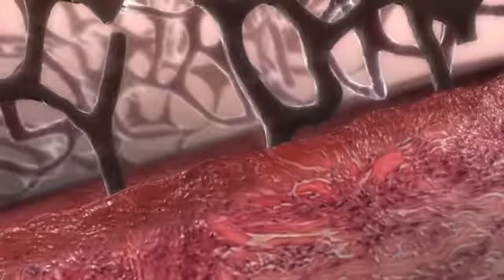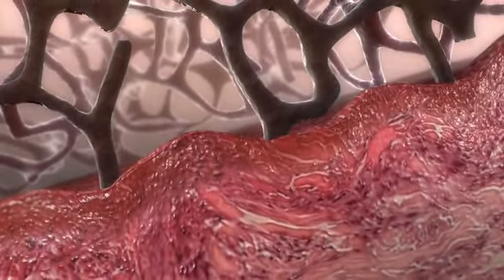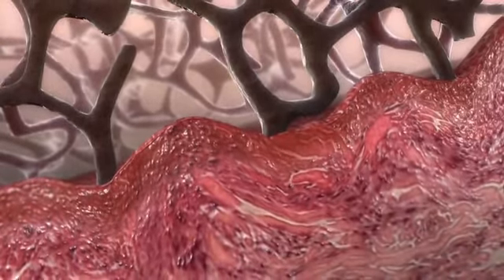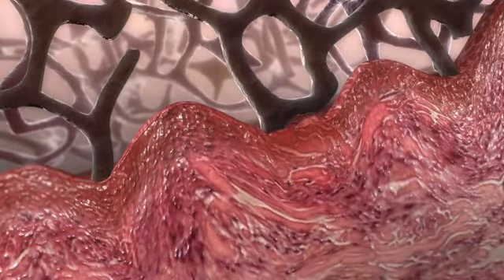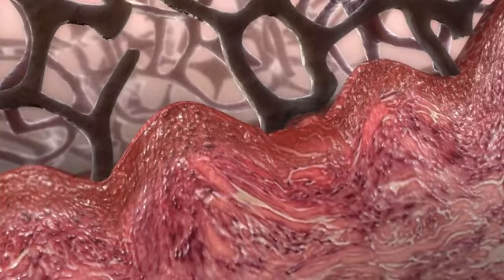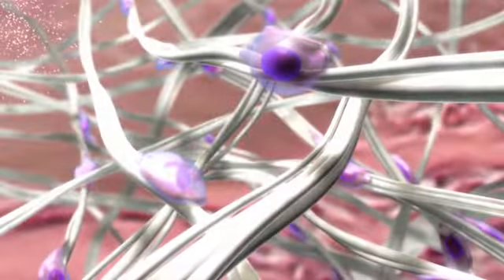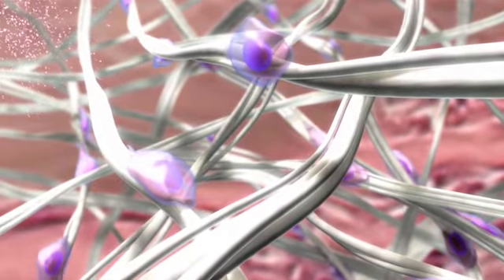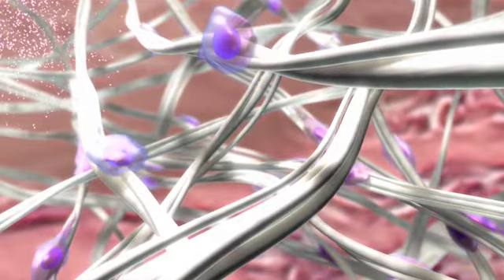The effects of the biological response are initiated by microstrain, which results from the manifolding of negative pressure across the proprietary GranuFoam dressing to the wound surface. This creates areas of cell surface strain, also called microdeformation. Tissue microdeformation at the cellular level leads to cell stretch. When cells of any kind are stretched, they are stimulated to expand, become thicker, and more metabolically active.